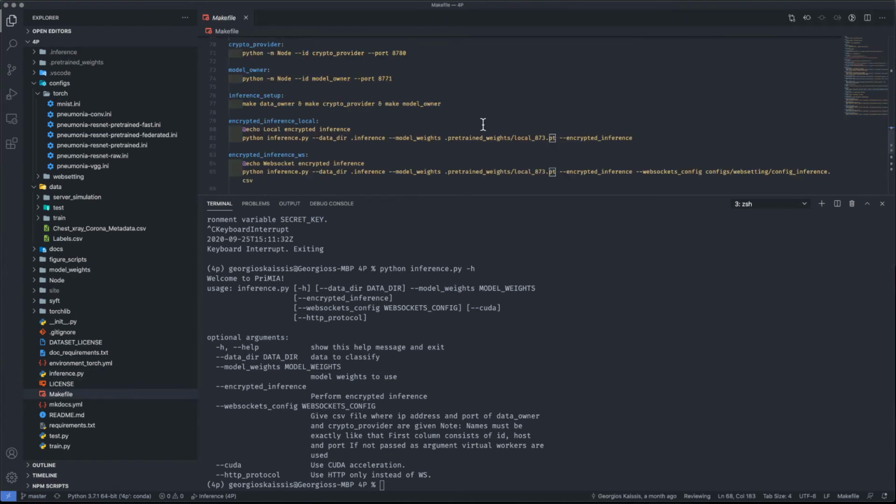ResNet 18, 11 million parameters is about 140 megabytes, and the net amount of network I/O, because of the huge fixed precision tensors that get pushed around between the workers, is about 10 to 12 gigabytes of network I/O for one inference pass. So that's rather demanding. Also, if you've got data caps, I wouldn't suggest doing this over the internet. It will work, but perhaps you will need someone to help you a bit with setting stuff up.